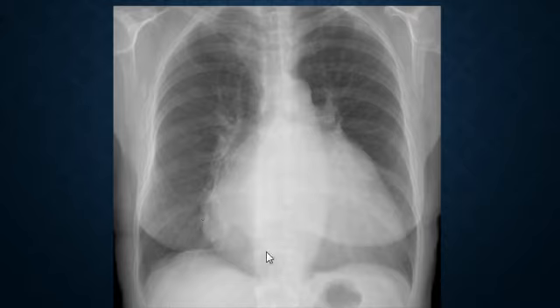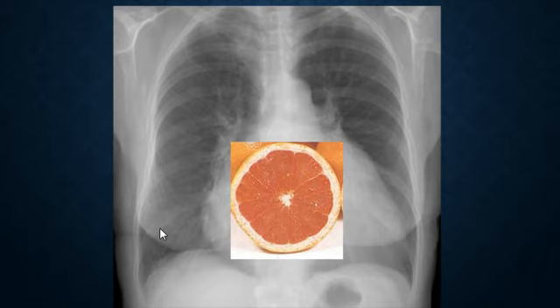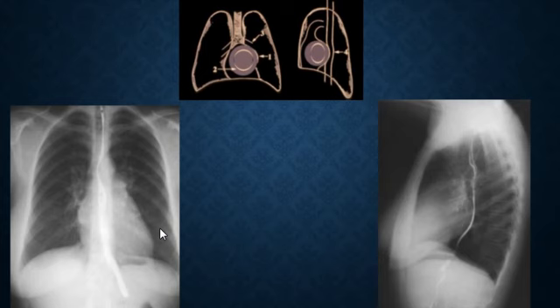Again, you can see here there is density over the cardiac density with the splaying of the carina. If you look at it en face, it is the left atrium that is superimposed on the cardiac shadow. Okay? Just to be clear that you understand the whole idea again, it's a density over a density.